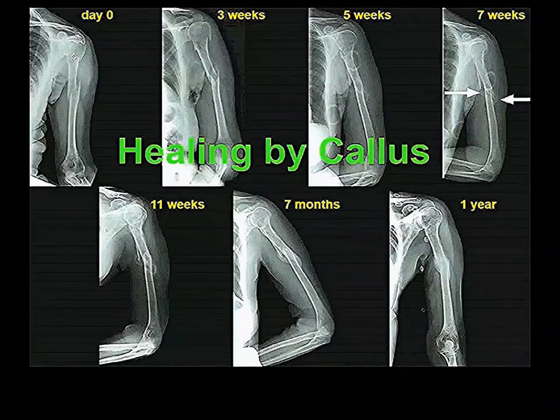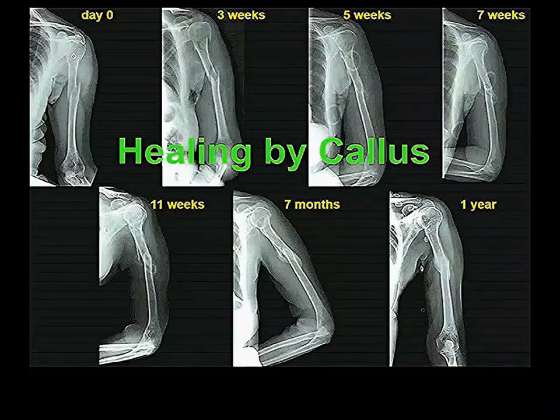Now you see a big white lump here and a big white lump there, so the bone is well along the way to forming. Big bump, big white bump. Now it's getting quite dramatic and strong, and then this is at a year. So this is completely healed now through this process called healing by callus. And this will eventually straighten out. I mean, there's a lot of irregularity in shape here, but over time that will straighten out. I just don't have any later x-rays of this. So there's two basic mechanisms whereby fractures can heal. One is the normal one, and the other one is plating, which only doctors can do.